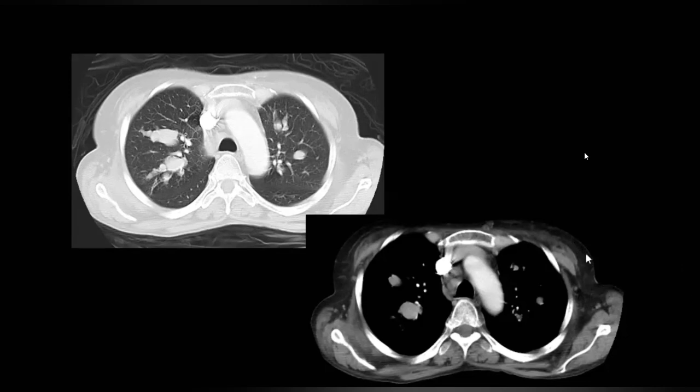The answer is the chest wall. Look at the chest wall. Do you think it fits a cystic fibrosis patient? Honestly, all the cases of cystic fibrosis that I've seen are very emaciated, thin persons. Yes, they don't have subcutaneous fat. But this patient is full. So this cannot be cystic fibrosis.